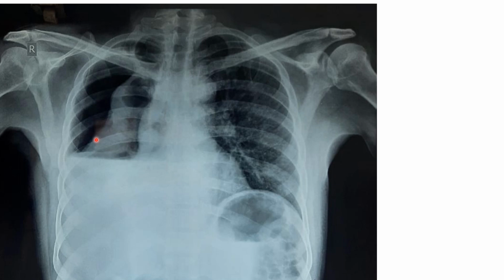If you keep the patient erect and then shift into, say, left lateral position, the air immediately comes and lines up in this lateral aspect, and the fluid will come down, right? Imagine a bottle half filled with fluid. As soon as you topple the bottle and make it lie down, the air will rapidly move to the top, and fluid tends to go down fast.